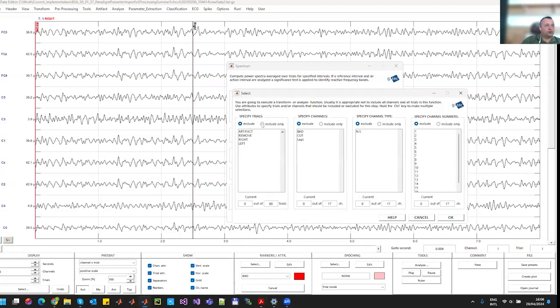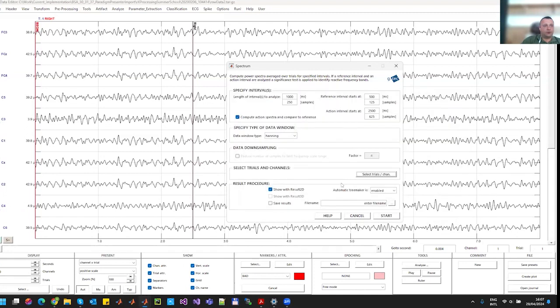We'll do it only for channel number 5. We'll include it only for the right trials, which is channel number 5, C3. So I will include only channel number 5. Okay, and start.